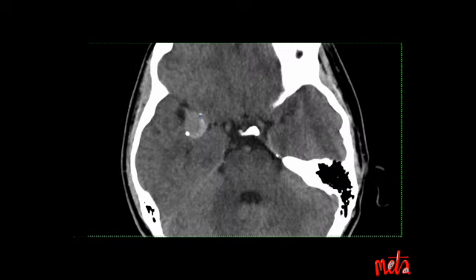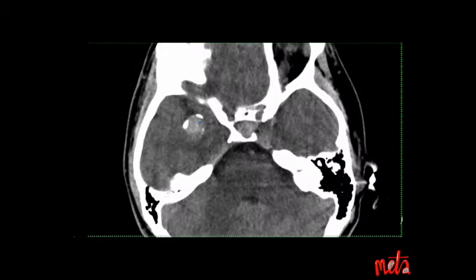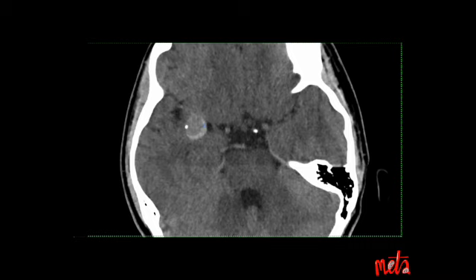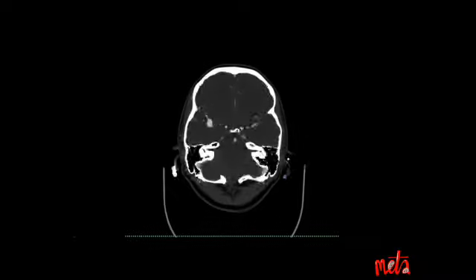Within the central aspect of the aneurysm, there is this heterogeneity. Firstly, there is this crescentic hyperdense or brighter rim, which the cursor is pointing to there, beside the darker central portion. The darker central portion is normal blood, and the hyperdense crescentic component is actually thrombus. And how can we demonstrate that that brighter component is thrombus? Well, we can do that by looking at the corresponding CTA.